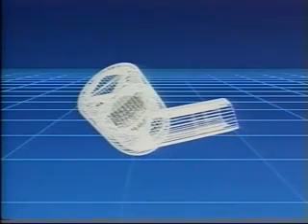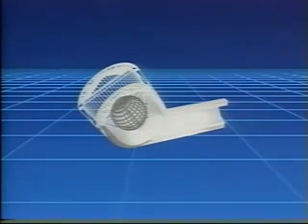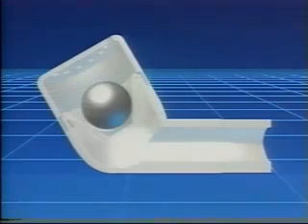Although your healthcare professional has already trained you in the use of your flutter, this video will assist you in using your flutter independently. The flutter is a device used to help loosen, mobilize, and eliminate mucus from your airways. The flutter consists of 4 parts: a mouthpiece, stem, a circular cone, a high-density stainless steel ball, and a protective cover. When you breathe out through the flutter, your breath moves the steel ball inside.